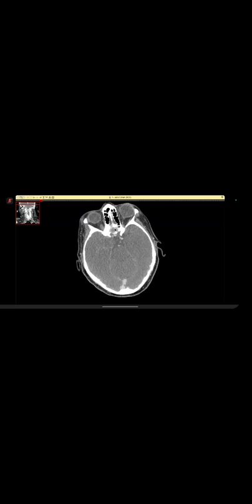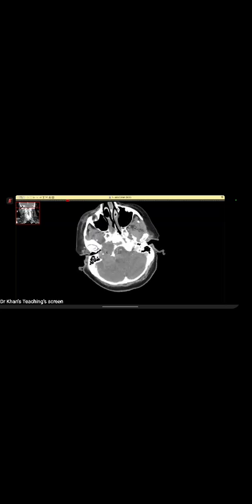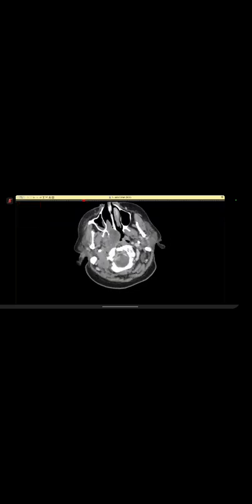On this CT, if we go here, we can see the superior-most extension of the mass, and then the same thing which I pointed out already. Here, what is happening? Now, this is the carotid sheath on this side, and this is the jugular foramen. And you can see that the jugular foramen is completely destroyed and encased. And where is the carotid artery? Actually, you don't see it. And maybe this was the reason why the patient had a stroke previously. This mass must be sitting there since ever.